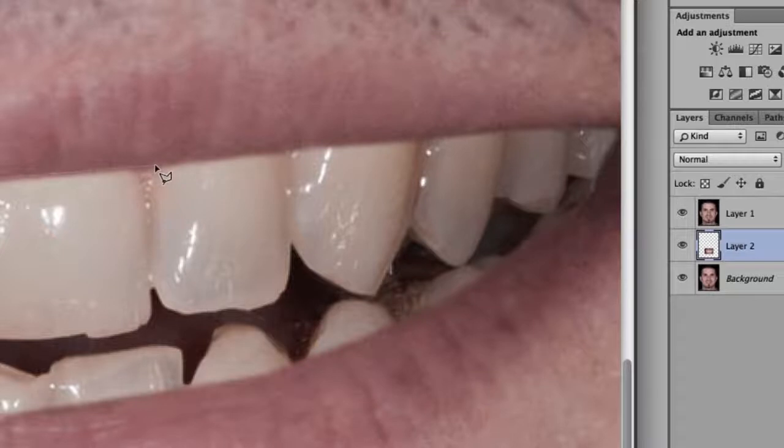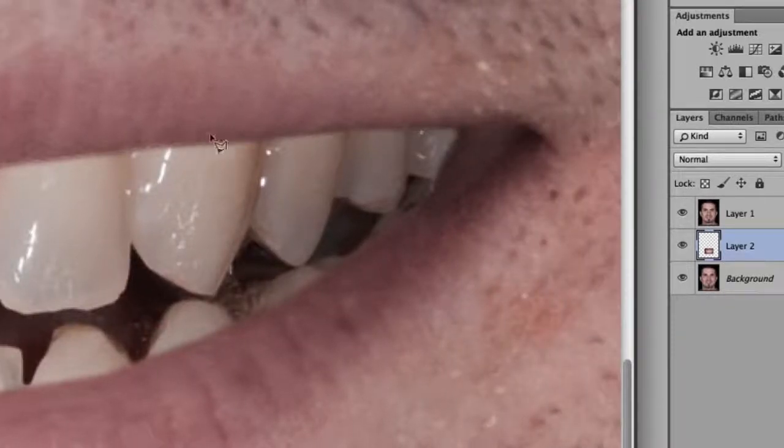This I do want to get a teeny bit of the lip. Okay. All right, so I'm going along. I can go off the side here to move it and come back, and I'm getting a pixel or 2 of the lips. And remember what I said in the other chapter, if I make some mistakes, how do I get rid of a mistake? Delete, delete, delete, delete, delete, and I'm back to where I started.